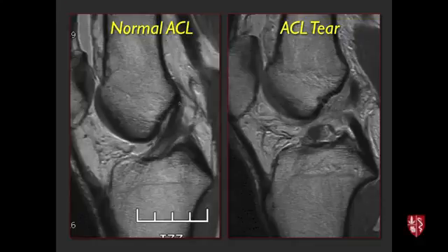Anterior cruciate ligament, right? And so here's femur, tibia, patella, okay? And so here's the anterior cruciate ligament coming off the femur here, coming down and attaching to the tibia here. On this example, you see part of it up here, and then there's a big gap here, and then that's there. So that's obviously a big tear. We just see part of the posterior cruciate ligament here because remember these are sections. They're about 2 to 3 millimeters thick, so you'd have to go to the neighboring sections to see the other parts of that ligament. And in a minute, I'll go through a scan here in a stack mode so you can see those things better.